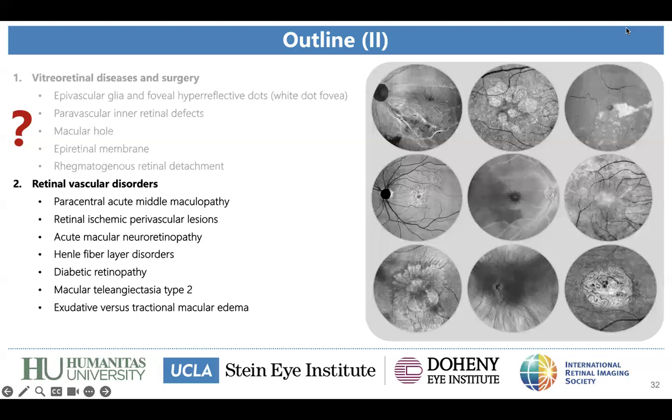And then, based on the presence, of course, also looking at the cross-sectional OCT. So if there are microaneurysms or other lesions like CME or exudates, we can also take a look at the middle retina, so at the deep capillary plexus, that I will show you very soon in the next section. And of course, if the patient complains about metamorphopsia or other symptoms, which can be related to the vitreoretinal interface, it's also very useful to use the superficial slab.